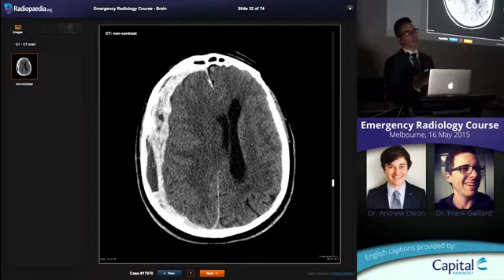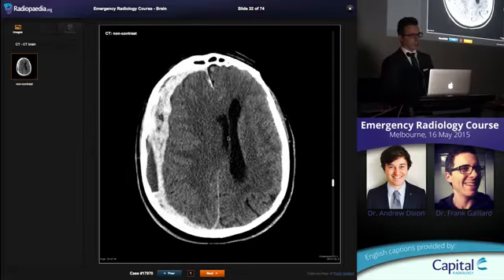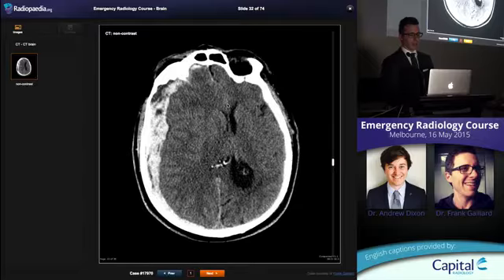And if any of you have seen a couple of 100 mils of blood in a kidney dish during surgery, it clots, but not all of it. It doesn't clot as a complete block. There's usually some serum that's expressed. So that's the serum, that's the clot. That's the midline shift. And again, we have hydrocephalus.